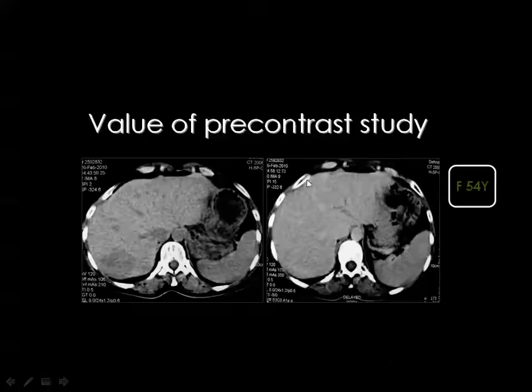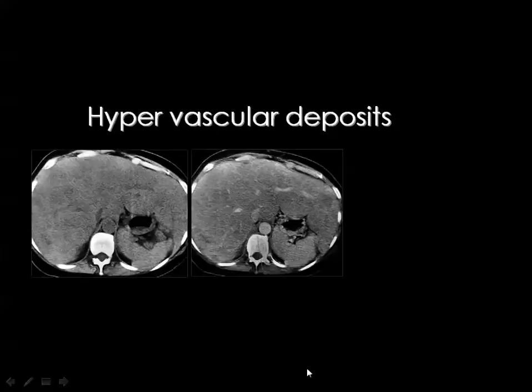Then if you started the examination with contrast injection and you didn't have the pre-contrast scan, you have the chance to miss one or two or some of the focal lesions, which are in many cases usually seen by ultrasound, of course, because of the different physical principle of the ultrasound and the CT scan. Then we performed this technique for some time, a pre-contrast scan and the post-contrast scan.